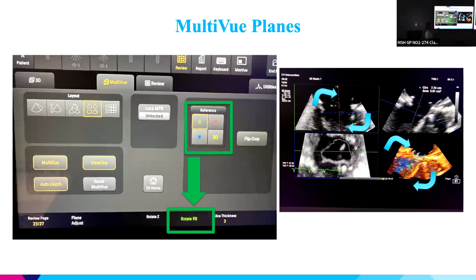When I have green selected, notice that now it's in green. It says rotate RB, because in my green plane, the crosshairs are red and blue. They put it in green color because we're working with the green box, but the planes that we're adjusting are the red and blue. So that's why it's RB.